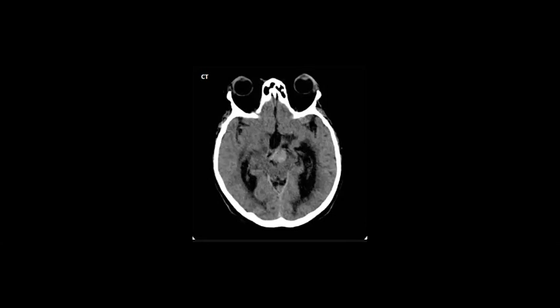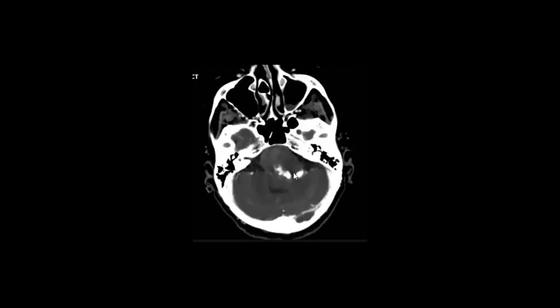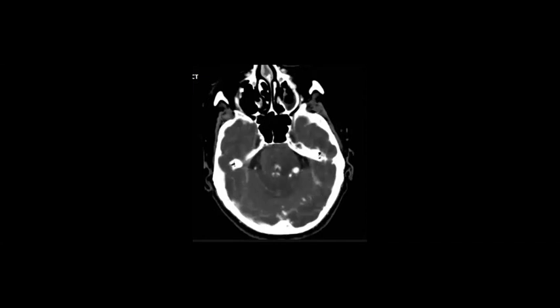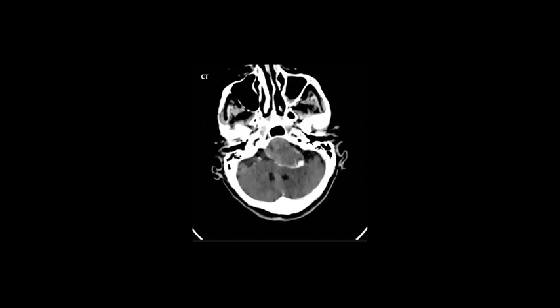And if you do a contrast image, sure. In the arterial phase, you can see that there is a dilated artery and there is hematoma inside. So the basilar artery is tortuous, elongated, and there is thrombosis inside the aneurysmal dilatation, and in the delayed phase as well. So this case, it is a giant aneurysm.